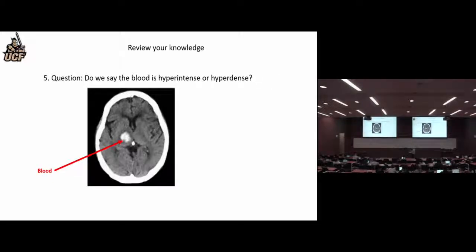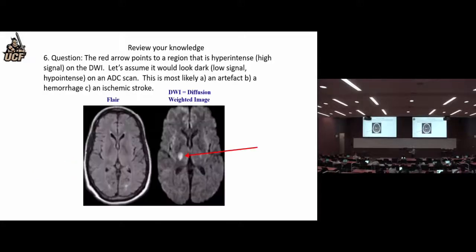And now, do we say the blood is hyperintense or hyperdense? Hyperdense, right. Hyperdense.